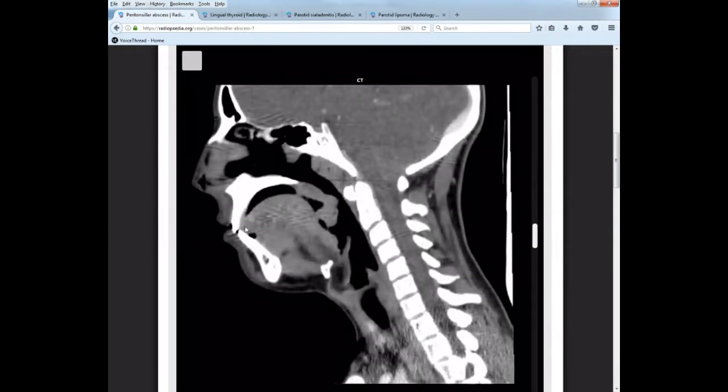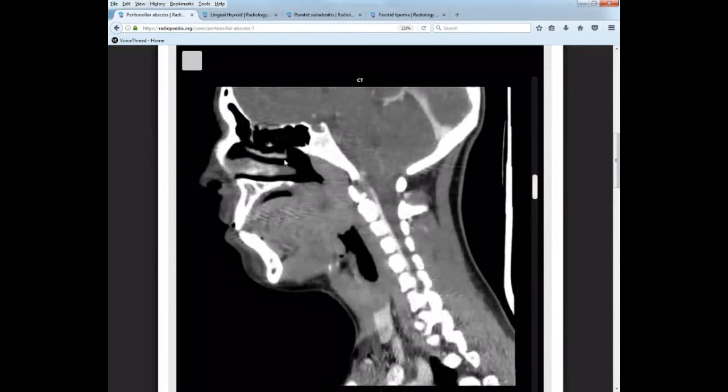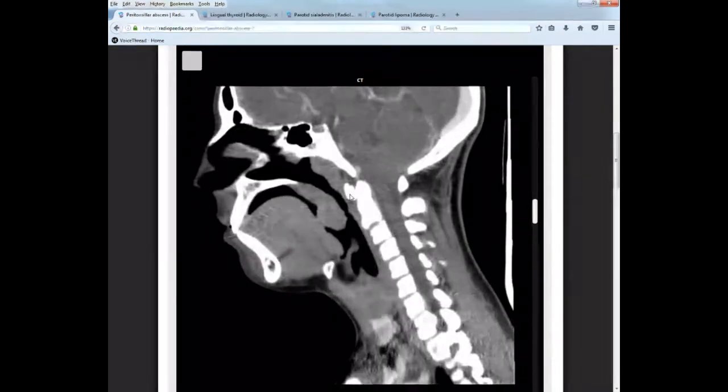The problem with this sagittal study is it's kind of thick slices, so we're not really seeing a good picture of the uvula. But when we know our anatomy, we know that we have hard palate, soft palate, and this little portion coming off the soft palate is the uvula that hangs down in the back of the throat, which we could tell this is the mouth right here, this is the back of the throat, tongue. This is tongue right here. Okay, so here's your uvula. So the soft palate, the superior portion of the uvula, over to the clivus and the anterior C-spine, nasal concha up here. That is your nasopharynx, this whole area here, okay?